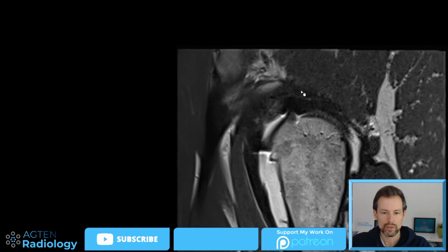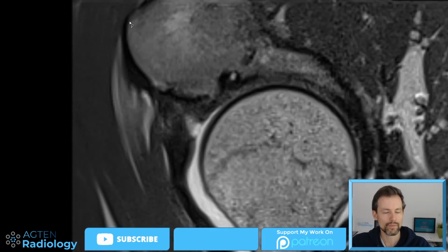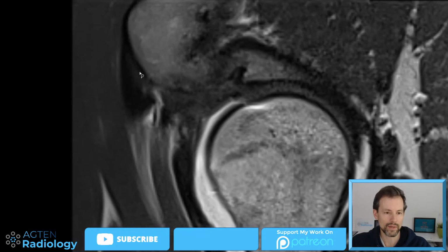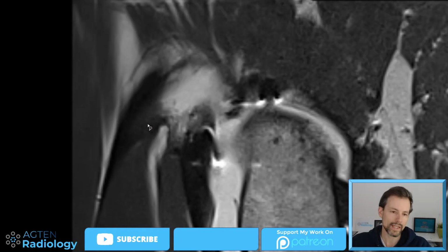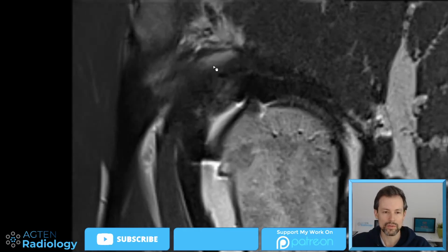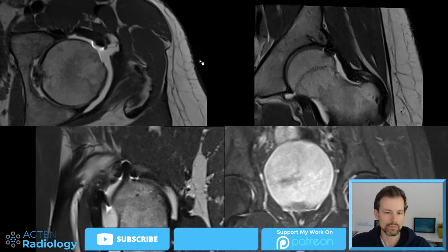Probably very well visualized in this sagittal orientation. We see the rectus femoris tendon going to the anterior inferior iliac spine here. This is the pars recta, the direct head, because it's very direct, it's straight, right? The pars reflexa makes this movement backwards and is slightly bent and reflected, if you will, hence the name. And first of all, there's not a lot of substance left. It looks strange. Normally there's more tendon.